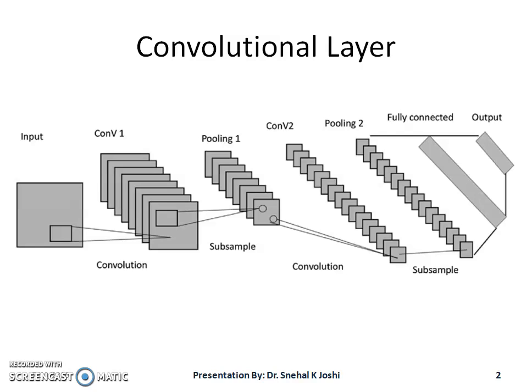Our testing data set contains 624 images, out of which 234 images are normal X-ray images and 390 are X-ray images identified as pneumonia. The convolution part contains two convolution layers. Each of them has convolutional subsamples followed by pooling layers. Finally, we have a flattening layer followed by the fully connected layer.